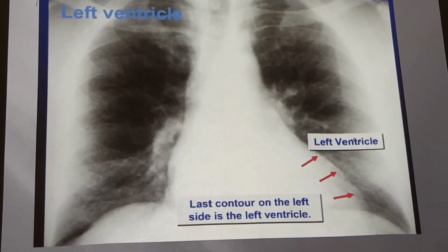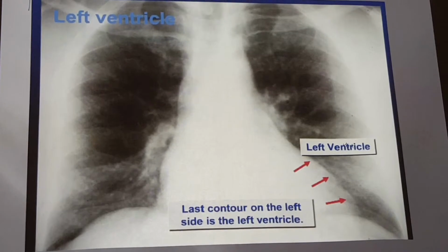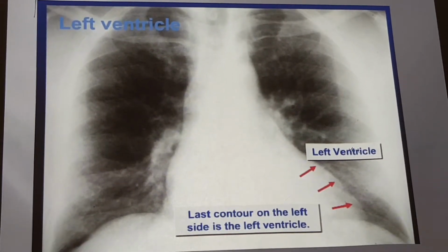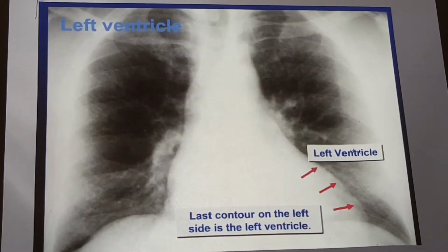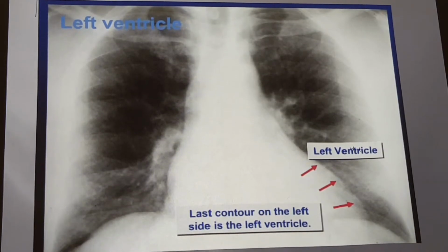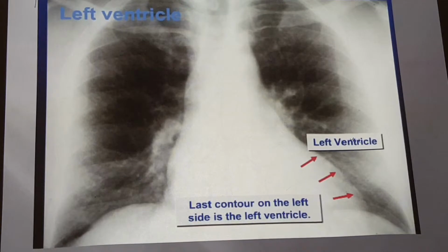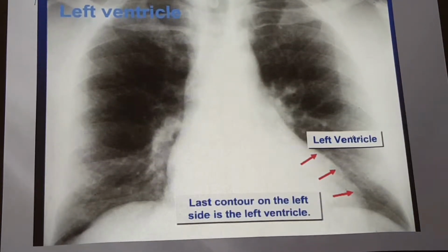left ventricular enlargement. Some radiologists will, in their report, only say the heart is enlarged. But you should ask what chamber is enlarged, right? This is actually helpful for the attending physicians. So the heart is enlarged, actually, is not a big statement for me. So next slide.